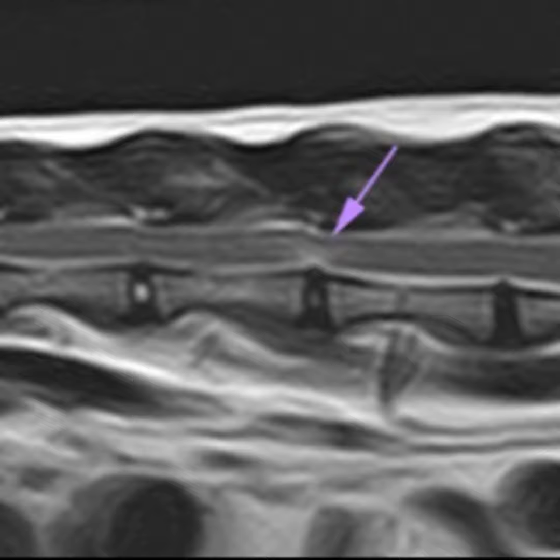In cats, 4 types of intervertebral disc herniation have been reported, with disc extrusion and disc protrusion the most common types, followed by acute non-compressive nucleus pulposus extrusion, and only 2 case reports of intradural intramedullary intervertebral disc extrusion. In our study, we found only 3 types of disc herniation, and surprisingly, the acute non-compressive type was the most frequent.